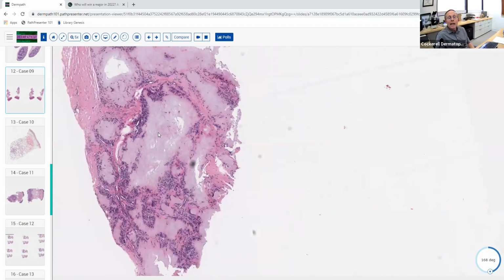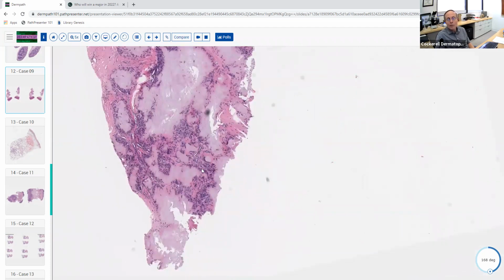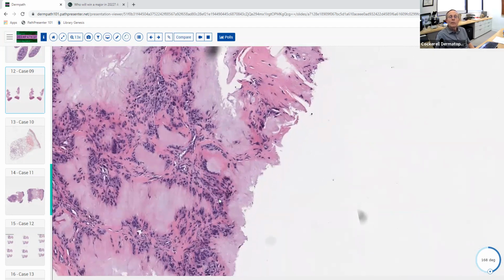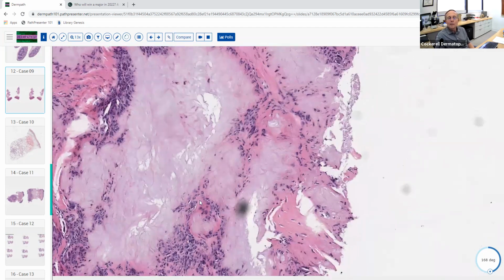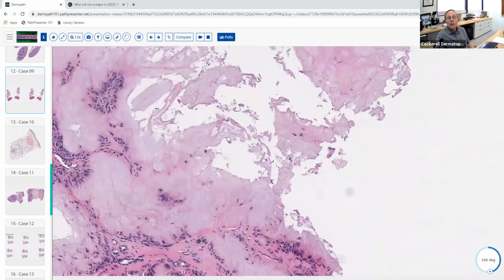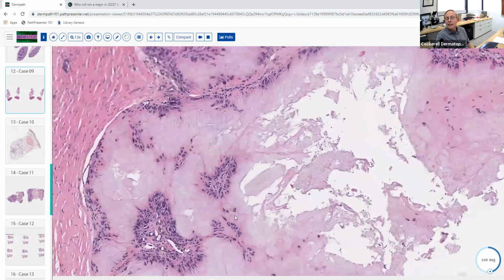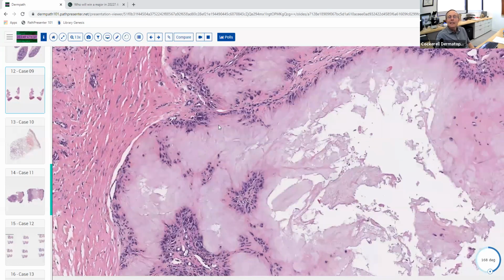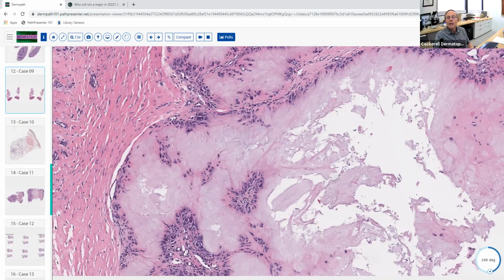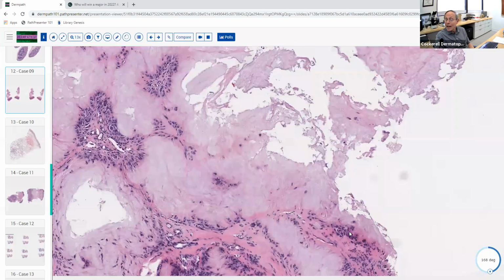So that's exactly right. Now, what they might try to do on something like this. If you're a somewhat nefarious writer of board questions, they're going to put some things on the differential here and try to trip you up. So they're going to say A, granuloma annulare, B, intralesional Zyderm injection, or exogenous collagen injection. All those things give you palisaded granulomatous inflammation surrounding something like that. Rheumatoid nodule, they might put that in there.